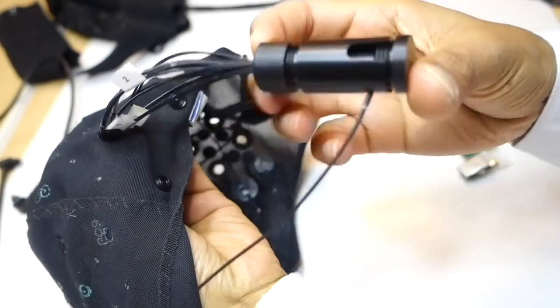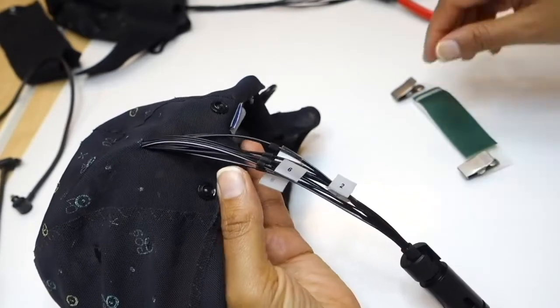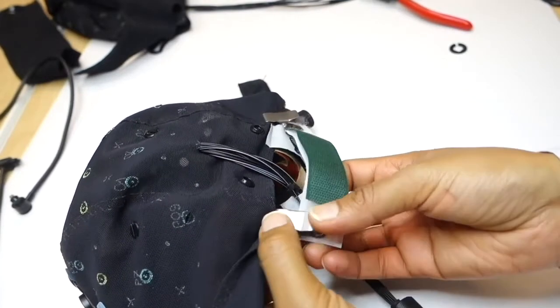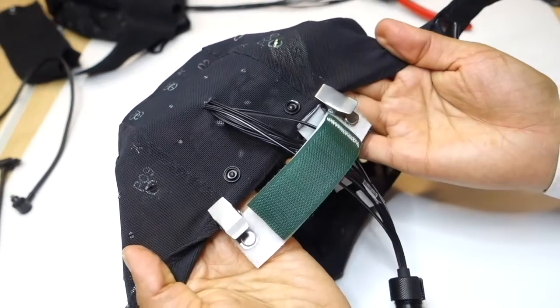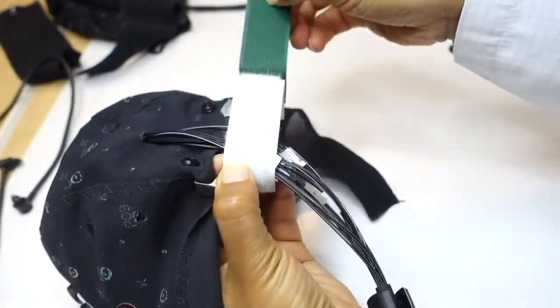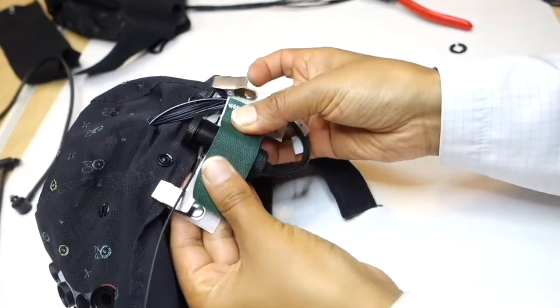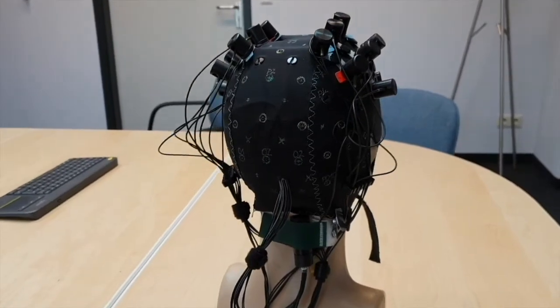To provide strain relief and to organize the detector bundle in a better way, use the provided Velcro clip. It could be attached to the base of the cap with the adapter seated inside. We'll see how to do that. So once you have your bundle out, you can simply open the clip and place the adapter inside this. And this is it. For a normal cap, you're all set hardware-wise to start your short distance measurements.